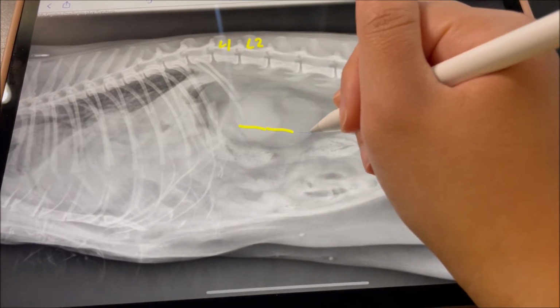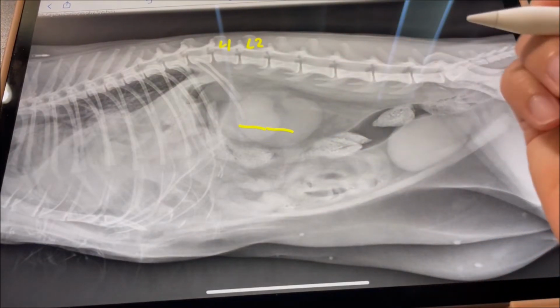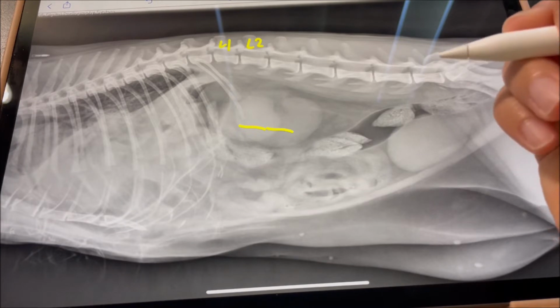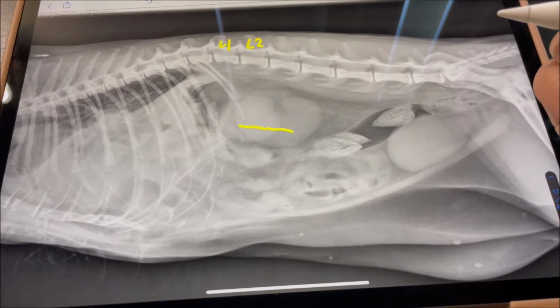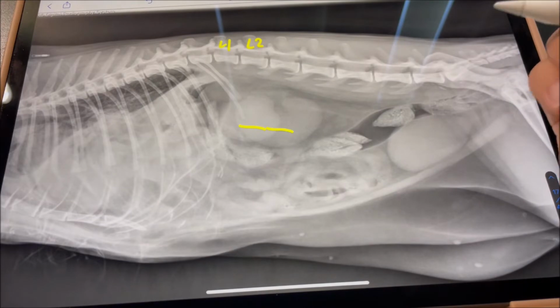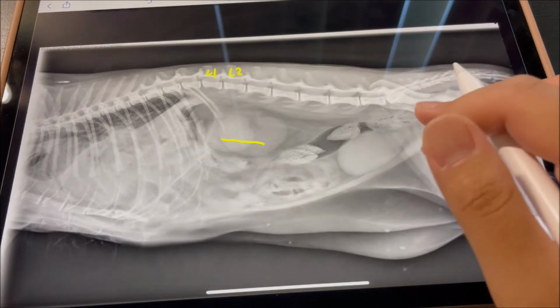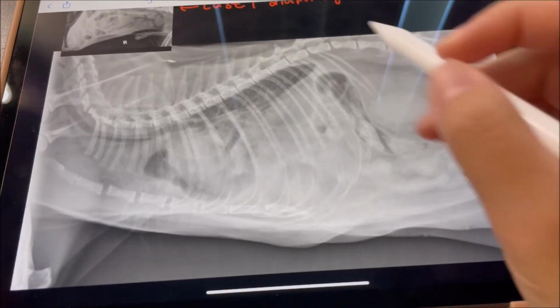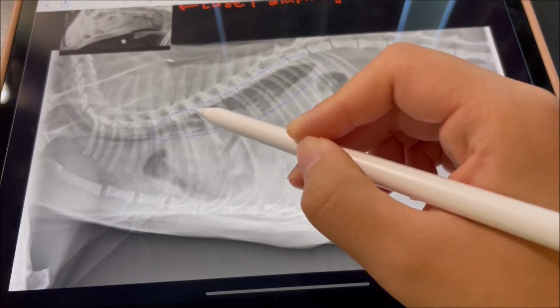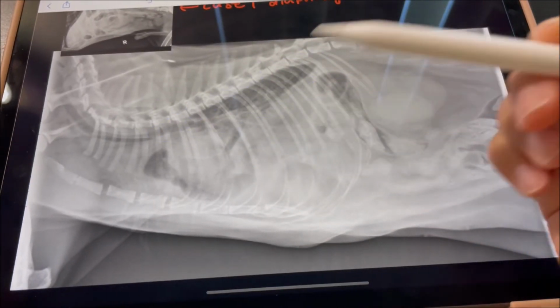And we still have a little bit left. So this is a cat, and one of its kidneys is definitely enlarged. It turns out that this cat was hit by a car and had hemorrhage and trauma. So whatever is causing the diaphragmatic rupture is also causing trauma to the kidneys, which is why it's enlarged. And that would explain the pain upon palpation during the physical exam. Also, note that this gas-filled organ, which is the trachea, has been displaced dorsally due to mass effect.